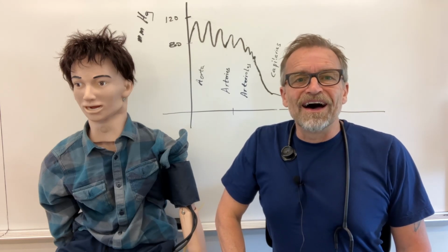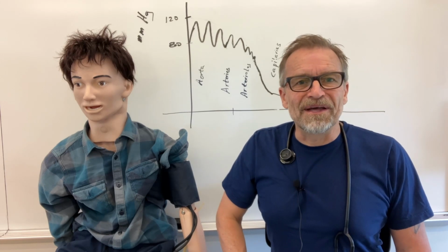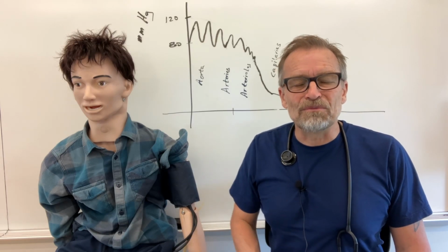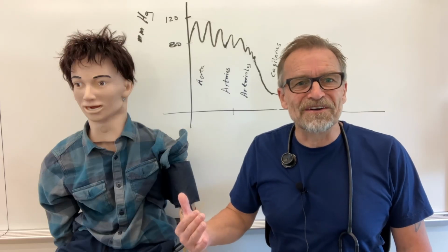Hey everyone, I'm back and I'm here with Creepy Andy, who's going to help me out and help me demonstrate blood pressure in a little bit. Don't let him freak you out. He's just here to help.